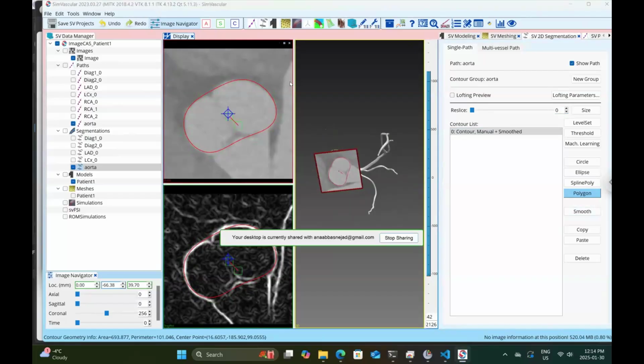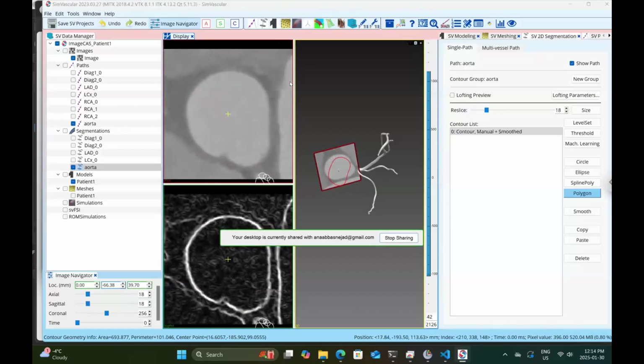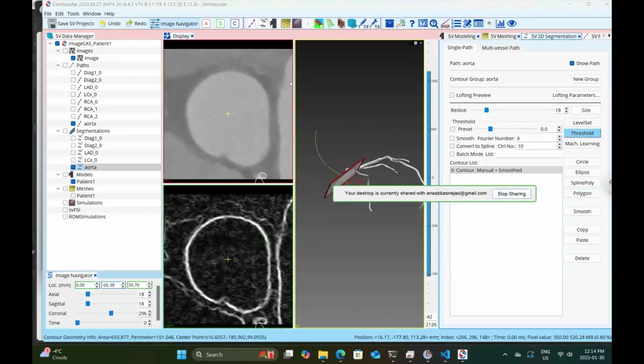Oh, you have never tried it. Okay, let's do 2D. Can I take over a little bit for one second? Yes, sure. This is what I remember. So I would take a threshold, place it on. It's not working. Let's click it again. Threshold.